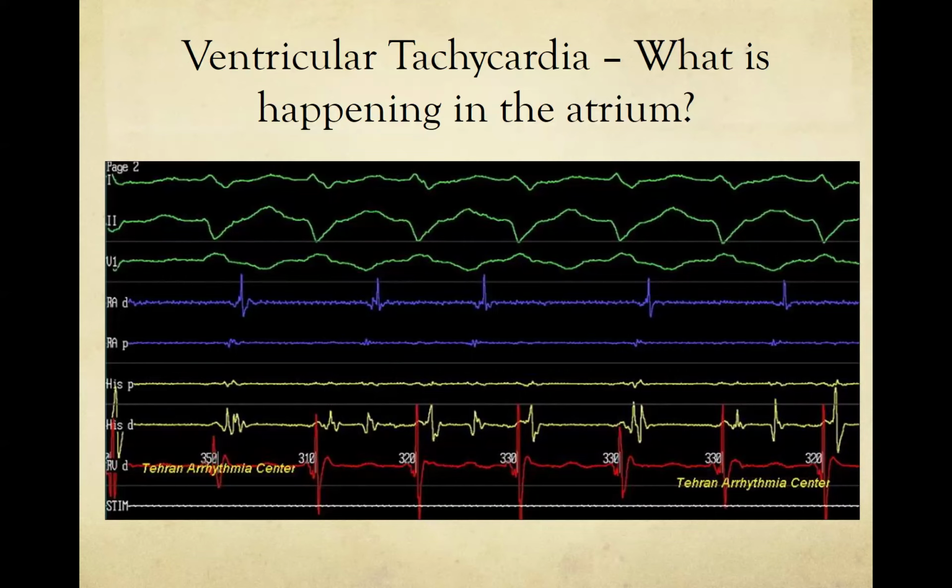Also, we don't know what the spacing is between the pairs on the proximal and distal. In our lab, we use catheters where the electrodes are 2 millimeters apart, and the pairs of electrodes, I believe, are 4 millimeters apart from one another. In this case, they seem to be at least 4 millimeters apart. I say that because the atrial electrogram in the proximal is quite a bit earlier than the atrial electrogram in the distal. So it does seem as if, for whatever reason, these two electrograms are not next to each other.